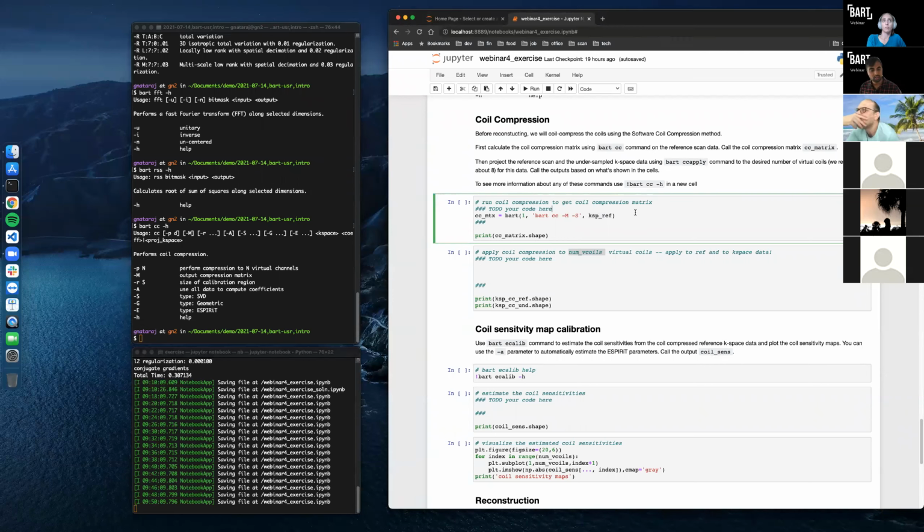So we need to use the full reference K-space here instead of the undersampled. Another name that's sometimes used for the data used for coil compression. Typically what you have at the time of calibration is the reference data. Could you also use the fully sampled? I think that's less conventional. Usually you use the reference data. Okay, yeah.